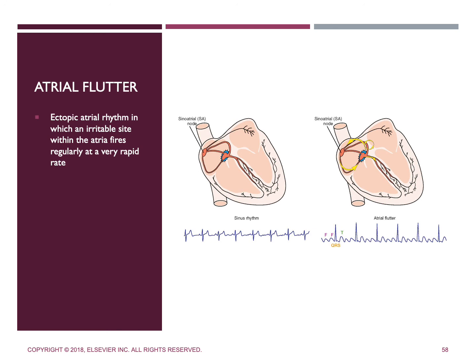We're typically going to see that the QRS complex is 0.11 second or less because atrial flutter is a supraventricular rhythm and the impulse is conducted normally through the AV junction and the Purkinje fibers. However, if flutter waves are buried in the QRS complex, or if an intraventricular conduction delay exists, that QRS will appear wide.